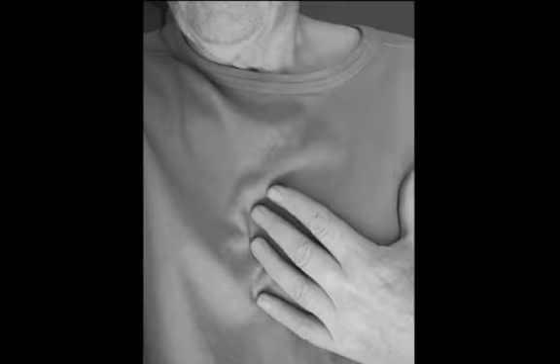See how useful this could be for your next patient with chest pain? Remember, those patients who have regional wall motion abnormalities on cardiac ultrasound are at higher risk for myocardial death than those who only have EKG changes. So can we add this interpretation of echocardiography to the emergency evaluation of high-risk patients as an adjunct to the EKG? Sure we can. Let's practice with some examples.